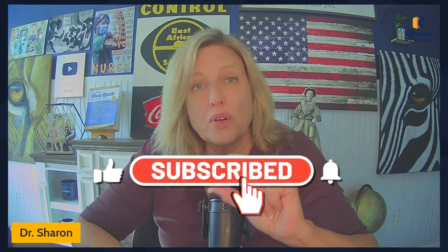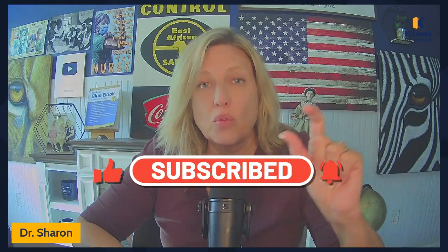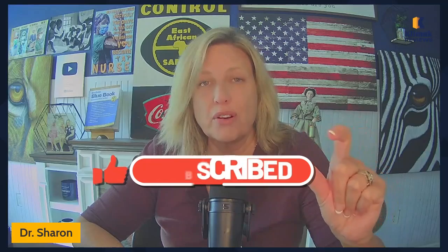Sharon with Clinic Reviews. Today, we're going to be talking about how you can tell the difference between a bundle branch block and a wide QRS that is a result of a ventricular beat. Remember, the W in wide goes with the W in weak. So a wide QRS equals a weak contraction. Remember, the QRS represents ventricular contraction. So if you have a wide QRS, you have a weak ventricular contraction, which decreases cardiac output. So we don't want our QRSs to be wide. So that's what I'm going to teach you the difference between.